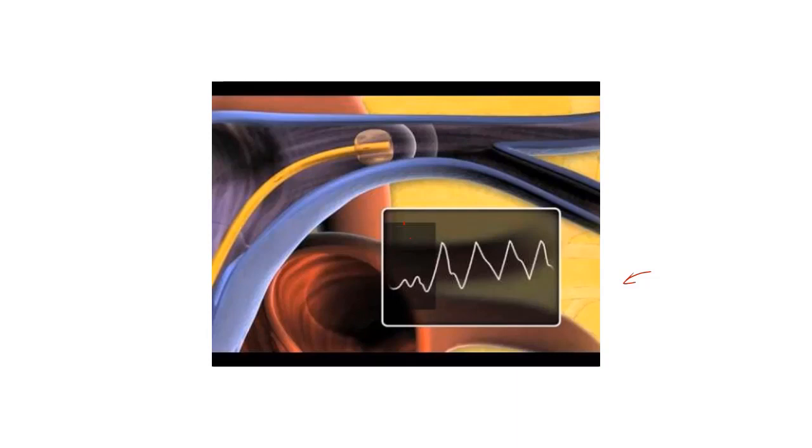So this is just an animation of the thermal element. We talked about how the one at Cooper has a thermal element, so it intermittently heats up the blood, and then at the distal end, where this white line is, it detects the temperature. Over time it can graph it and get an area under the curve to get the cardiac output. And since this is heating itself up based on a time, you can get continuous cardiac output monitoring. So every 30 seconds or so, it'll update.